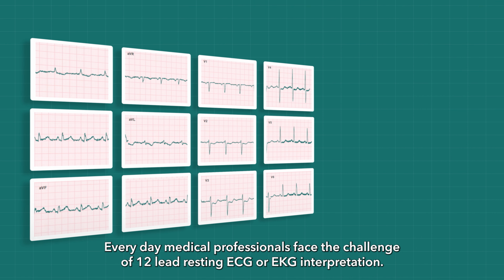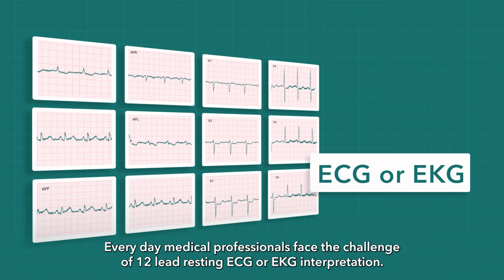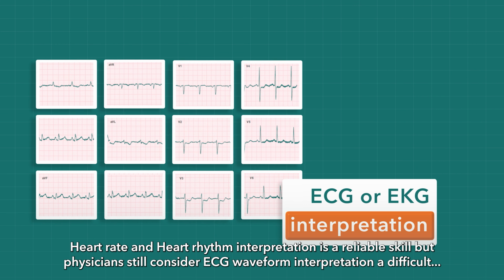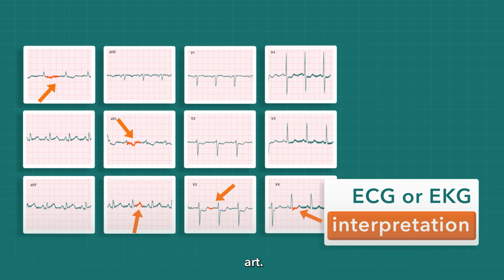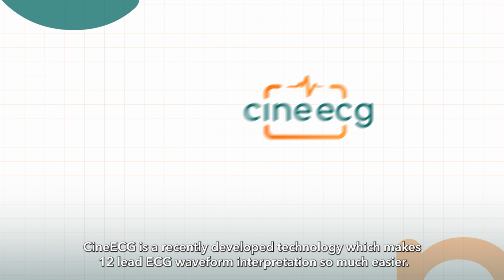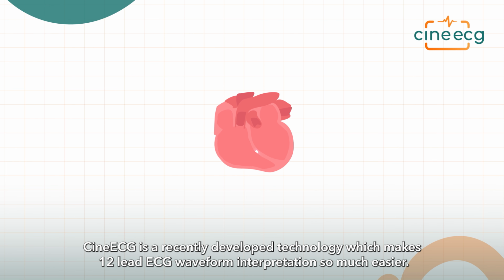Every day, medical professionals face the challenge of 12-lead resting ECG or EKG interpretation. Heart rate and heart rhythm interpretation is a reliable skill, but physicians still consider ECG waveform interpretation a difficult art. CineECG is a recently developed technology which makes 12-lead ECG waveform interpretation so much easier.